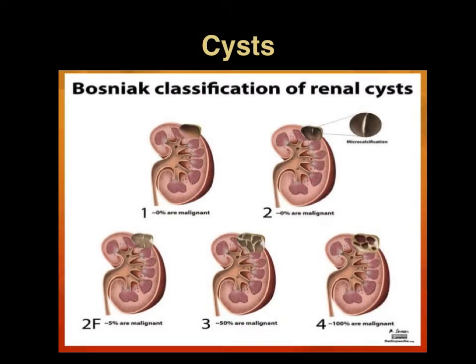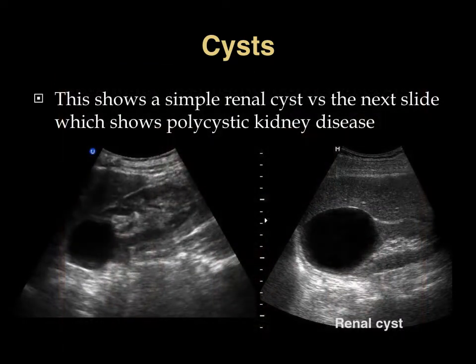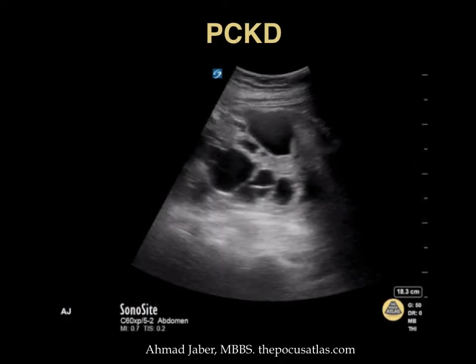Approaching the end of our lecture, we will touch briefly on the appearance of renal cysts, as they are not an uncommon finding on point-of-care ultrasounds. Most cysts we see are simple, uncomplicated cysts. These will appear as well-circumscribed anechoic collections along the periphery of the kidneys without any septation. Compare that with this slide of polycystic kidney disease with clearly more complex appearing cysts throughout the kidney.